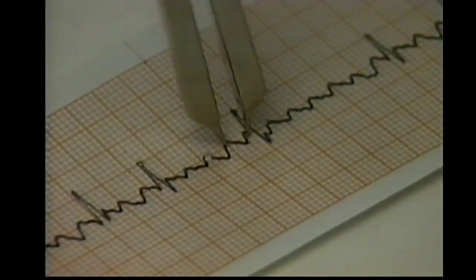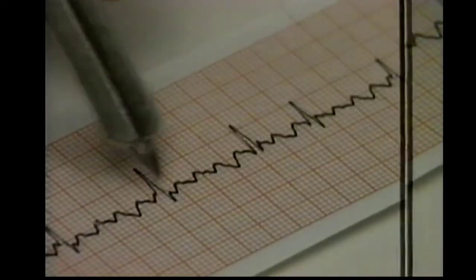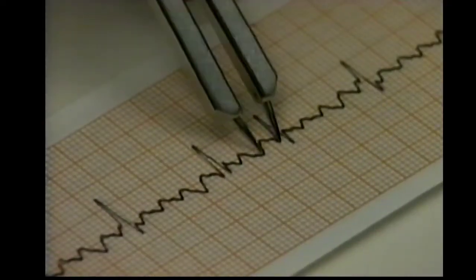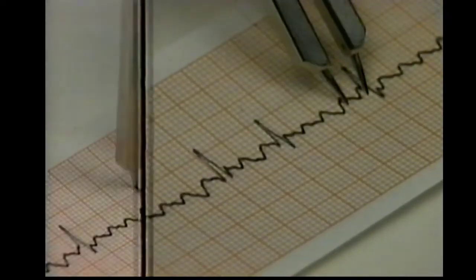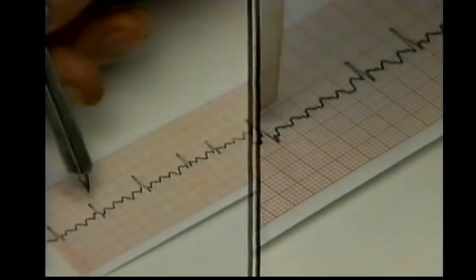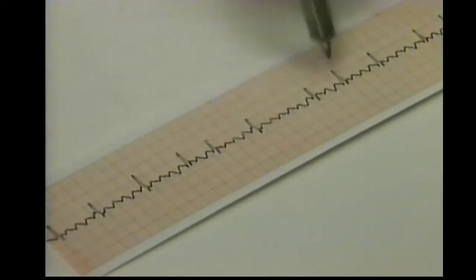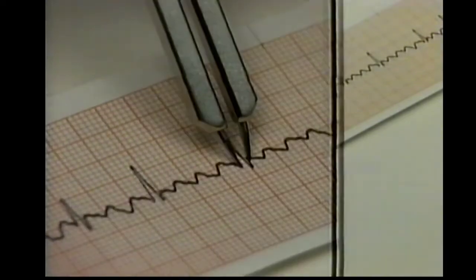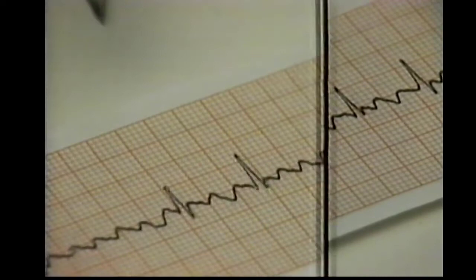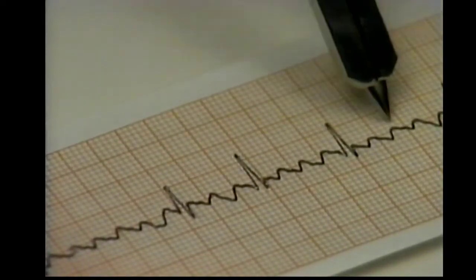The atrial rhythm is regular because the F waves are regular. The atrial rate is about 370. The PR interval cannot be measured. The ventricular rhythm is irregular, and the ventricular rate is about 80 beats per minute, which is less than 1/4 of the atrial rate. The QRS complex duration is 0.08 second. The QT interval can't be measured because the T waves are not clearly seen.